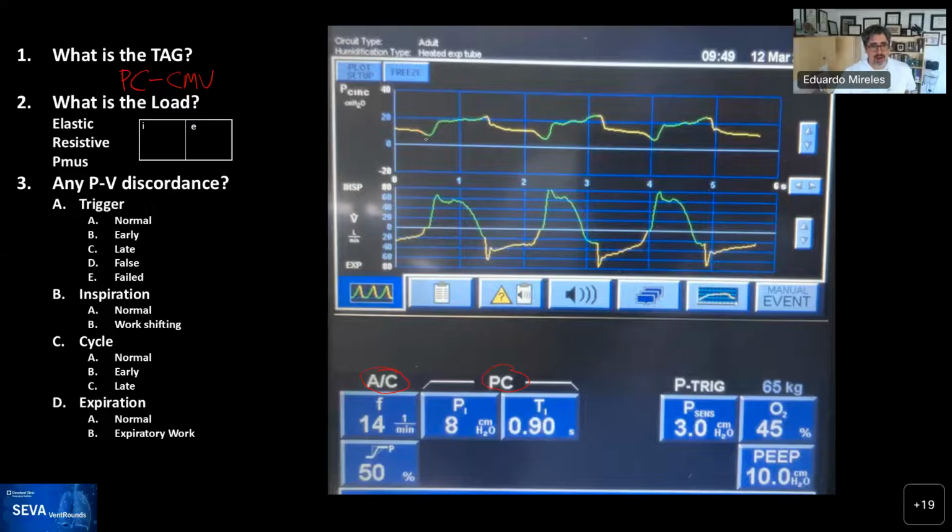And so that's a telltale sign that the ventilator is controlling the inspiratory time. And because it's controlling the inspiratory time, the patient said, I want to exhale. And so the patient exhaled against the ventilator, giving the pressure, and actually was exhaling during inspiration. So that tells you that this is a mandatory breath because the cycle is controlled by the machine.